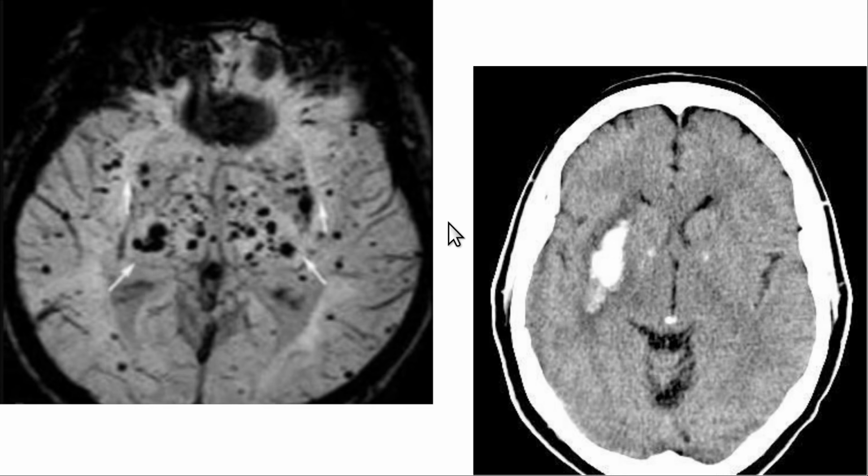Okay. All right, here's the SWI sequence, susceptibility weighted imaging. On susceptibility weighted imaging, they obtain the images real fast, and they don't do anything to minimize artifacts. So in a magnetic field, if you have a bleed, the blood has heme in it, which has iron in it, which has a little bit of a local magnetic field around itself. And that'll cause a distortion of the MRI image. Normally, other sequences have correcting gradients that remove them, and they perceive them as an artifact. But SWI is actually called a magnetic susceptibility artifact, is what you get from heme, from the iron in blood. So these are all little intracranial bleeds.